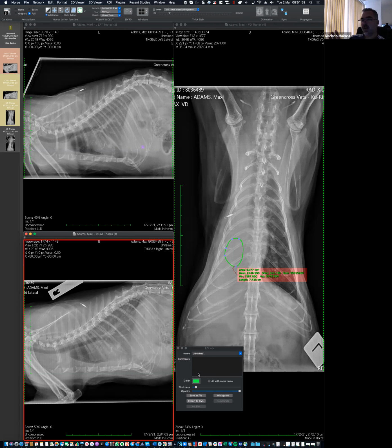And you will see that what they may share is the unilateral or asymmetrical distribution. The point that they will not share is that in a pyothorax, that accumulation of fluid in the pleural space, in sacs, let's say in focal areas, is not an even distribution and always results in some degree of mass effect. And it always results in us seeing that border of the lung being displaced. So I promise I will bring a case and we can put one against the other and try to learn more about what the hints are when we have this asymmetric distribution.